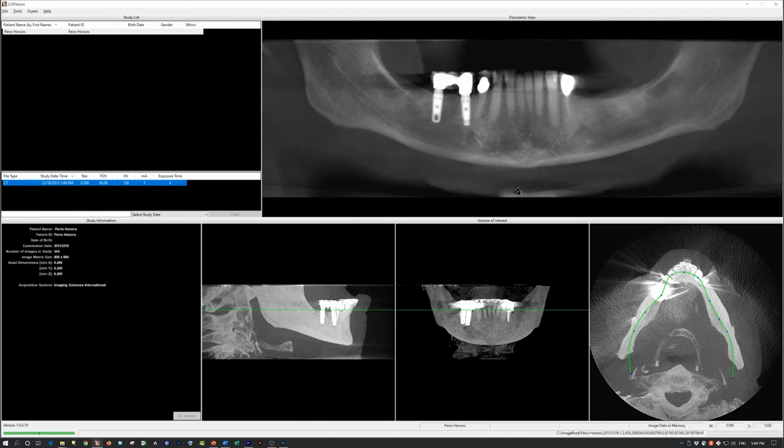So by now we have learned how to open a scan, how to adjust the contour line, how to save workup, and how to adjust the rotation of the head. If you click on any of these screens, it will take you to another window. I'll be spending some time with these three windows. Let me start with this window, an option that I rarely use.